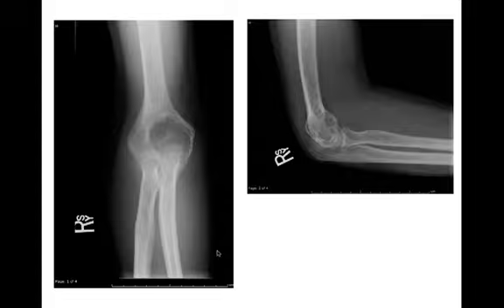All right, so we already saw this case. This was the chondroblastoma we saw earlier. So really quickly, this is a geographic lytic lesion, narrow zone of transition, non-sclerotic border, which is eccentrically located in the epiphysis and metaphysis of the distal humerus. Harder to see on the lateral view. This was the chondroblastoma. And remember, chondroblastomas are epiphyseally located or epiphyseally based lesions. So one of your differentials for an epiphyseal lucent lesion is going to be a chondroblastoma, especially in kids and young adults. That's the age range that these occur in.